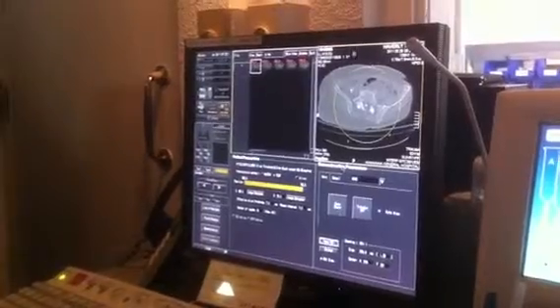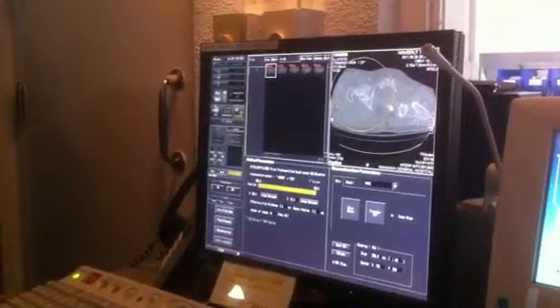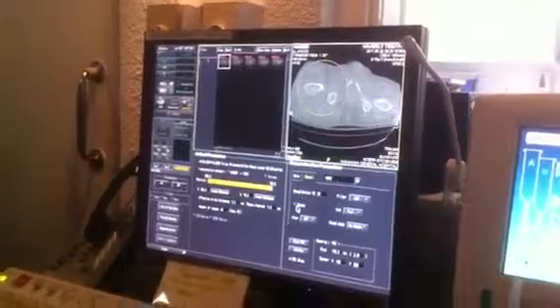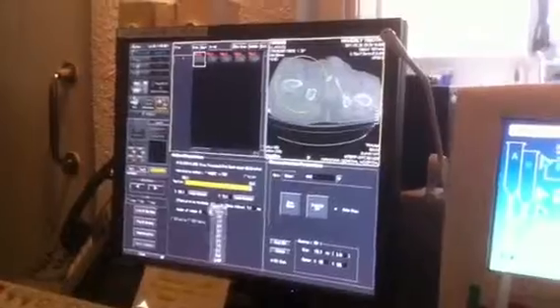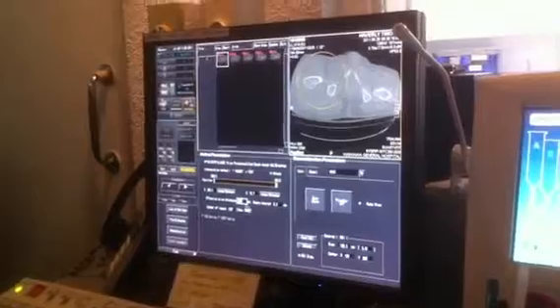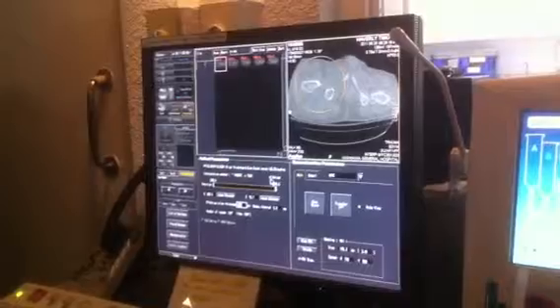So I'm going to go to set ROI. And now I can do the hip. I'll keep it in bone, except I'll turn on boost here. And I'm going to make a volume, because I can do the rest of it in MPR, right? The axial, sagittals, and coronals. And then reconstruct. How do you set the volume? If you pick 0.5, if you pick 2 and under, it will automatically check this volume box for you.